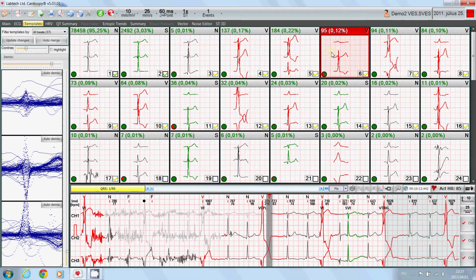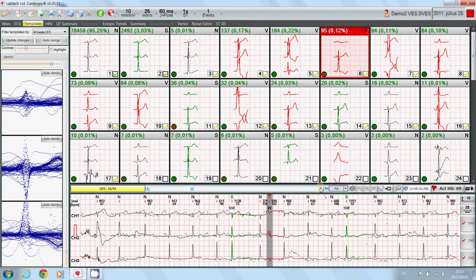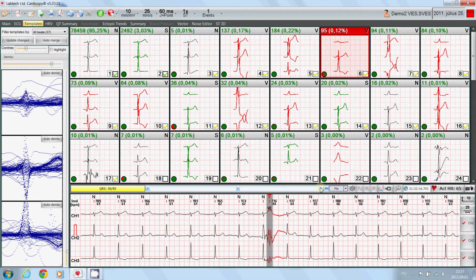Just like the sixth, which is mostly okay, however it contains lots of noisy beats, which normally you would want to fix, but I will not do it in this case, because I've already shown you how to do this.